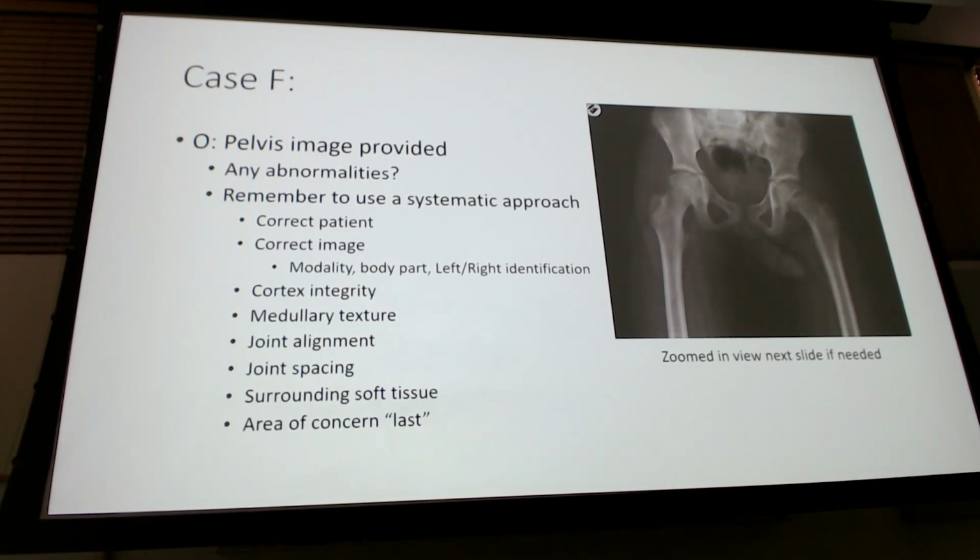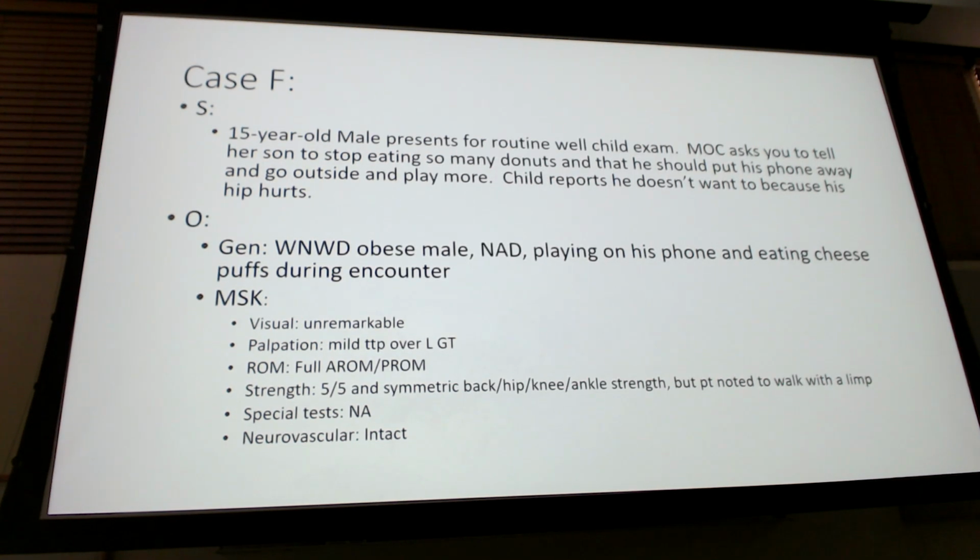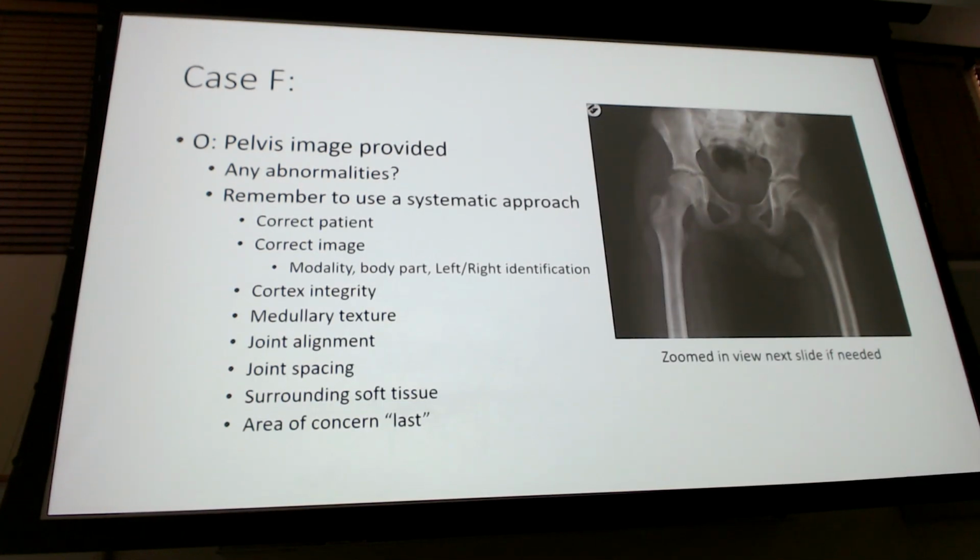Here's my X-ray. Look at this. If you're on your slideshow, you can just go to the next slide if you want. It's a little more zoomed in. Let's see if you can find it on this one first. See if you can notice. Right, we already know we're looking for hip pain. Right? I specifically did not label which hip, because I want you to find which hip.